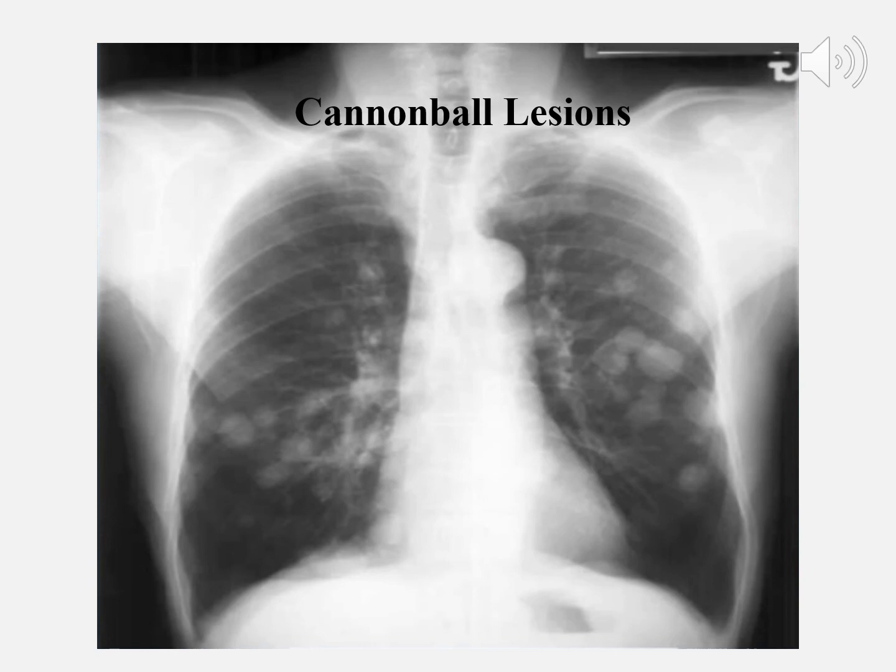Cannonball lesions. I don't know if I've ever seen this in practice, but these are generally metastases as well. Cannonball appearing masses. They look like cannonballs, but these are normally metastatic lung lesions.